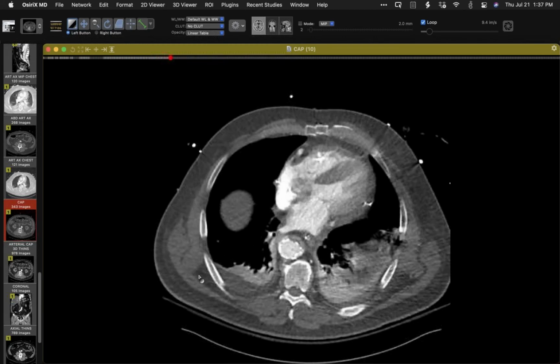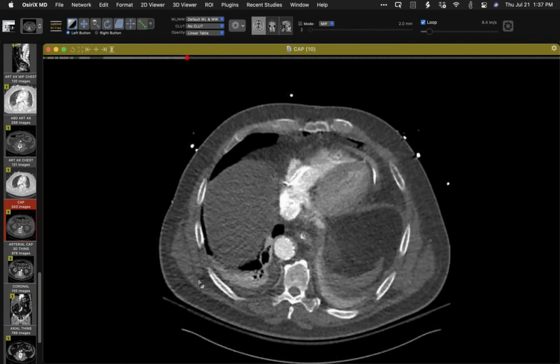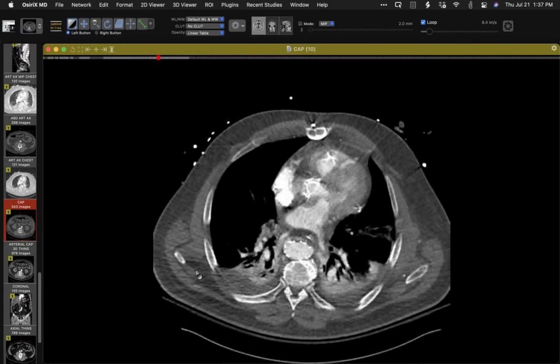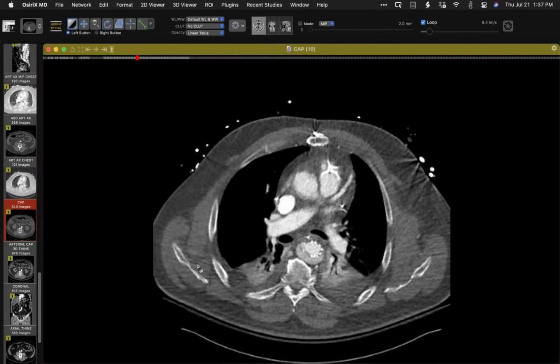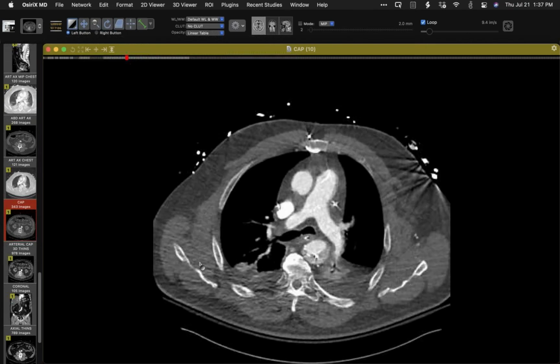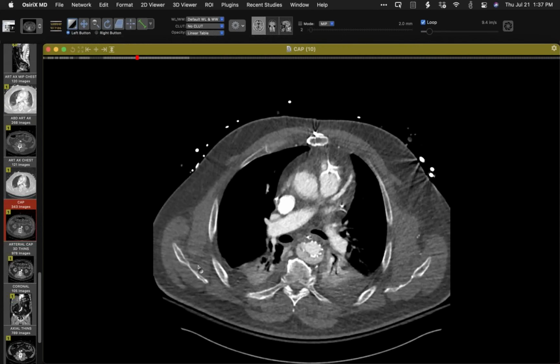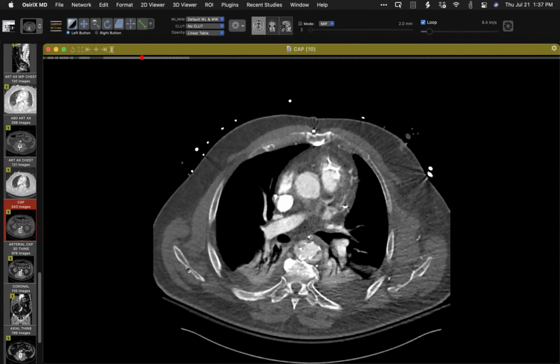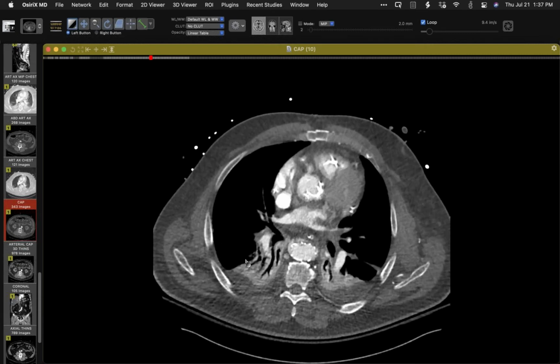to here, and I'll go back up again. Anyone see anything interesting? Yeah, it looks like it went into the false lumen. Yep. You can see it makes a turn right there. And now below that, this is the false lumen.